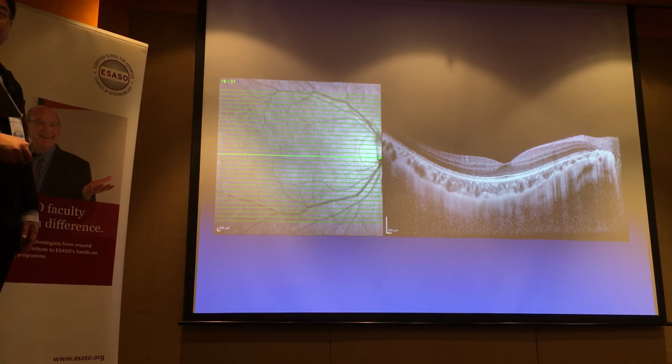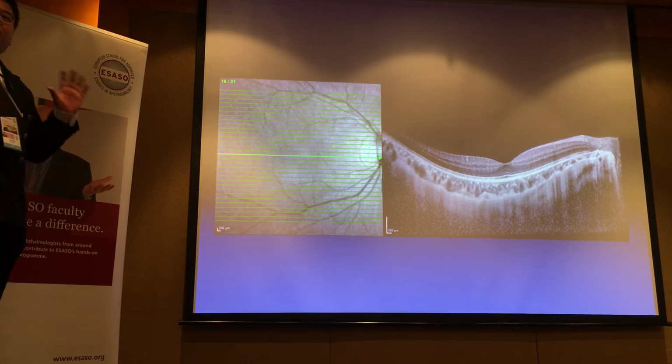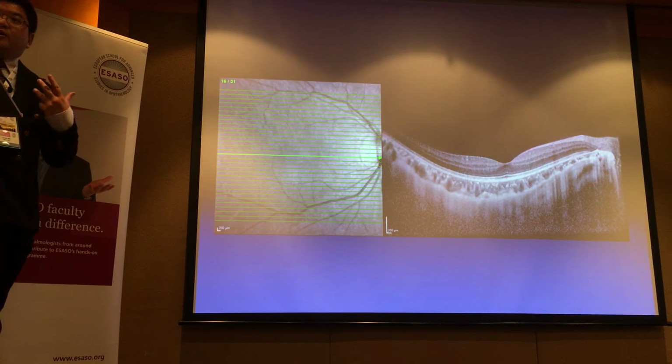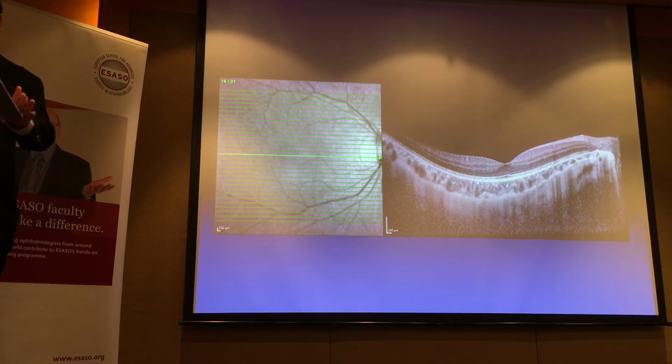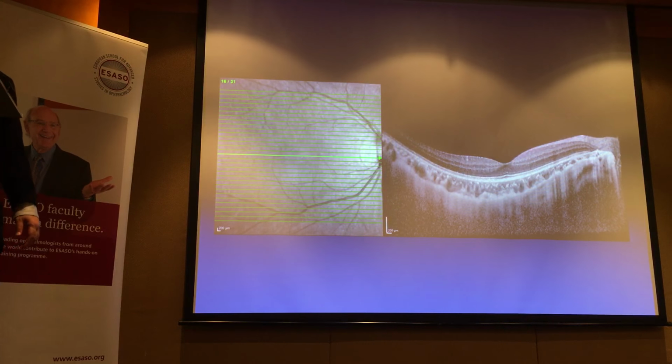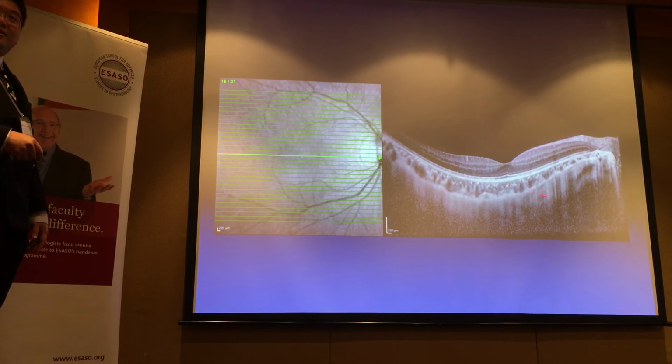How I would measure this, if I were doing the calipers, is I would take this point, I think we would all agree on this point, and then I'll draw it here. The question is, how much of the hyper-reflective part do I incorporate? I agree there's variability there. I would probably include just, because you can almost imagine a fairly smooth line coming down like this. In my clinical research, we assume a smooth line and draw it to that point. Therefore, we assume that this is part of the boundary. But some others I know will feel that you should just follow the dark areas between the vessels.